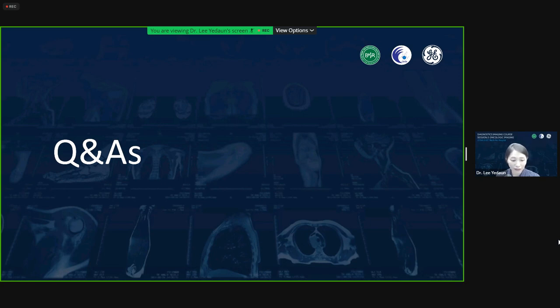Until now, I do not recommend the use of low dose CT for HCC diagnosis, but as you know, deep learning reconstruction for low dose CT has developed, and I think that's very helpful for improving image quality, especially GE.